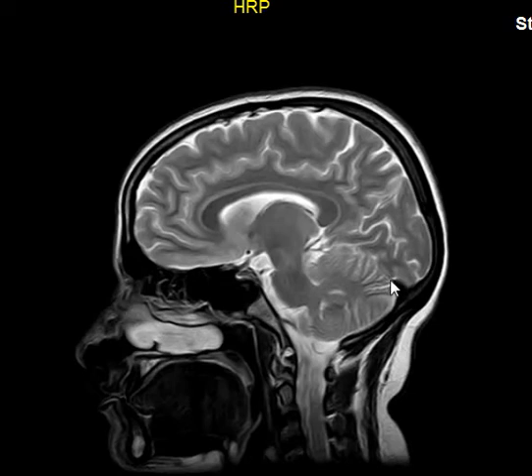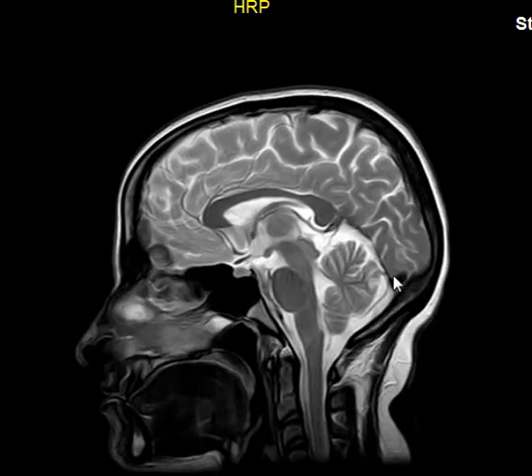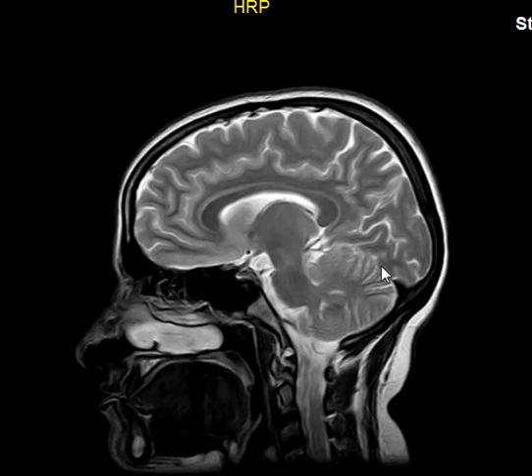So we have the falx cerebri in the middle, and the tentorium cerebelli transversely separating the cerebrum from the posterior fossa in general and cerebellum in particular. So we have the supratentorial compartment and the infratentorial compartment.